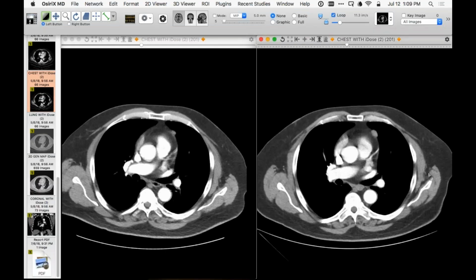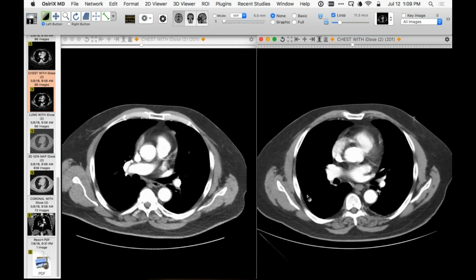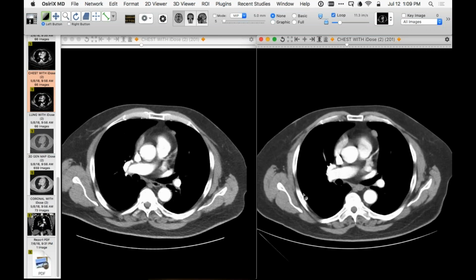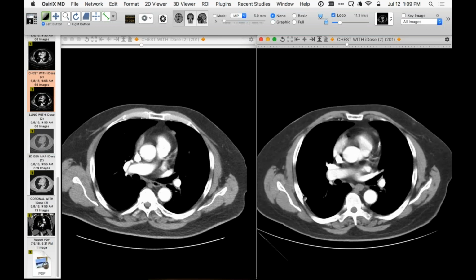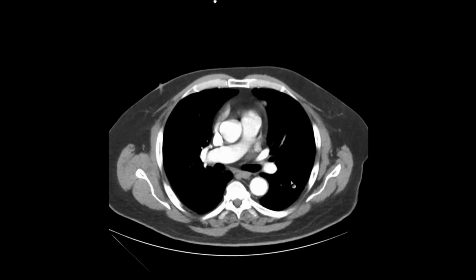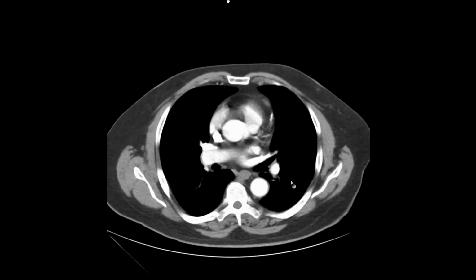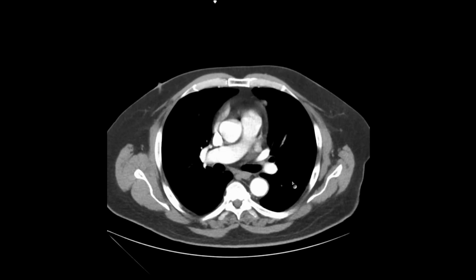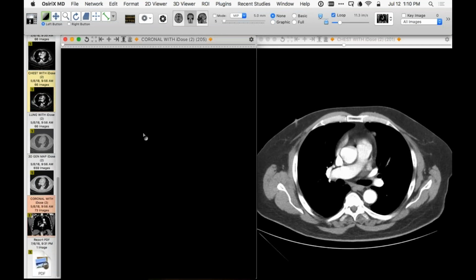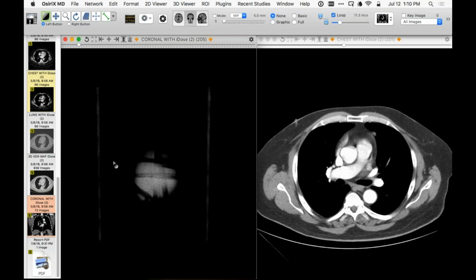So Howard, it's interesting on the CT to the right as you were scrolling up and down, and I don't know if it's volume averaging, but it almost looks like as you go to the undersurface, it goes deep to the pericardium, right? Like that image below right there. Are there sagittals or anything like that? Let's see what I have from the outside. I have a coronal. I was looking to see whether I have thin cuts.